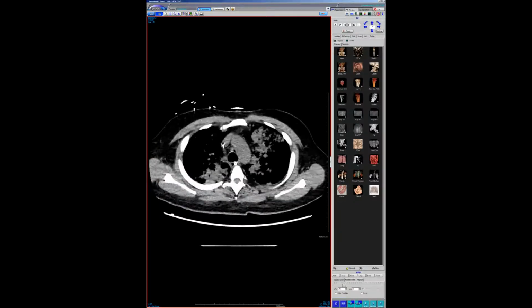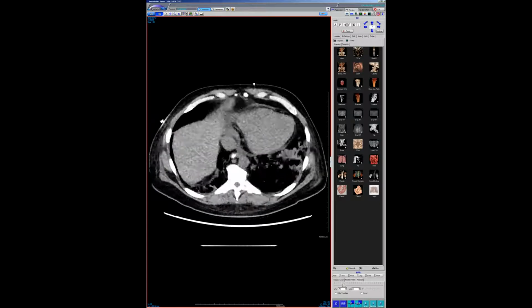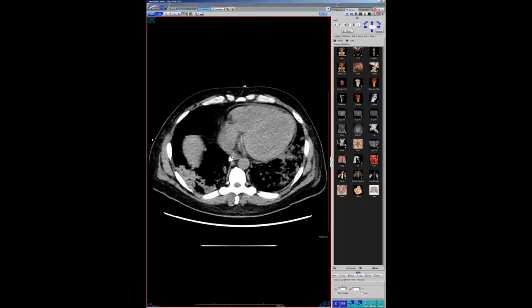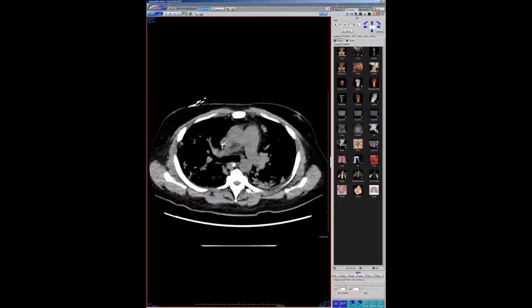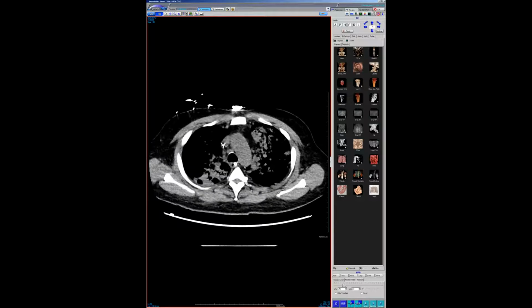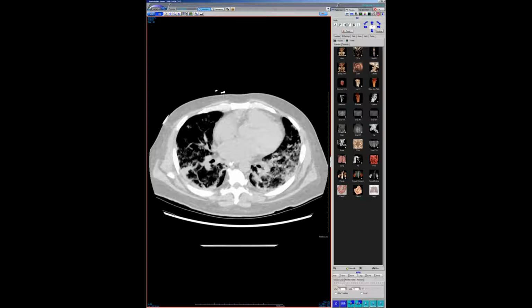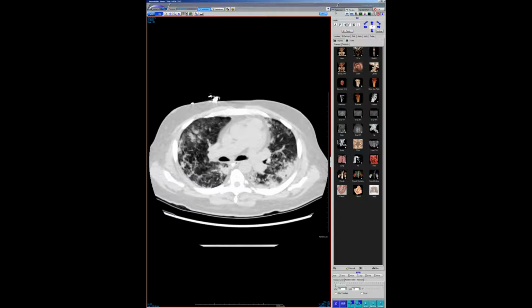I have a case of lipoid pneumonia from, I think we may have seen it on the webinar, or someone showed one, but I think I have one too, of a mild lipoid pneumonia from someone who put it in their nostrils, but it was never that extensive. I've seen it with Vicks and it's been mild, it's been dependent. If it was just the dependent stuff, I'd be like, yeah, okay. But it just doesn't make sense to me. That's really dense consolidation in those upper lungs.